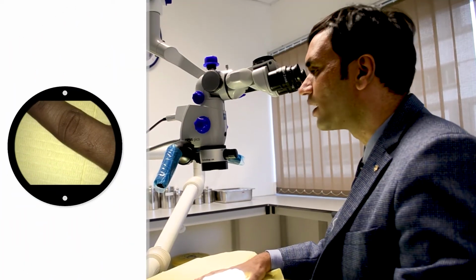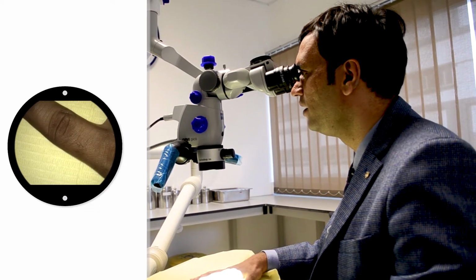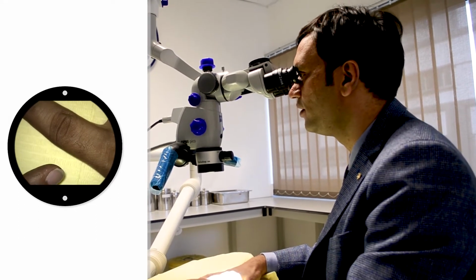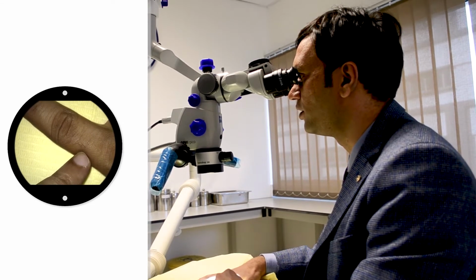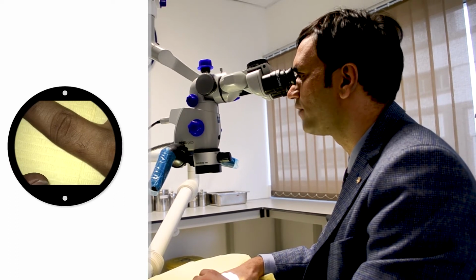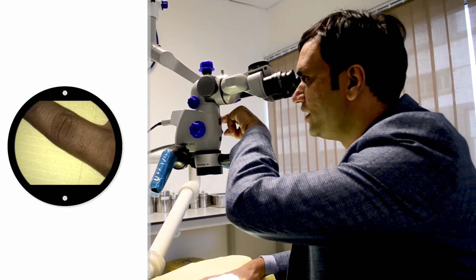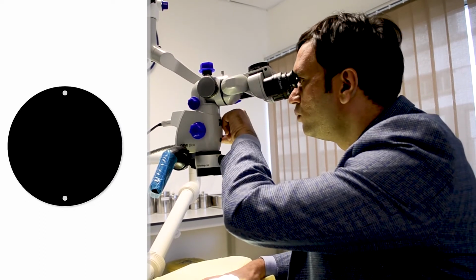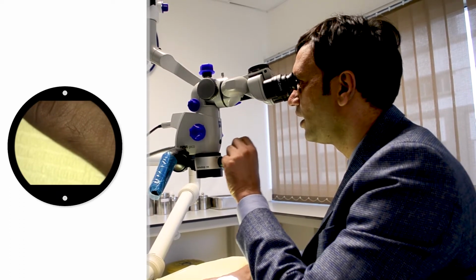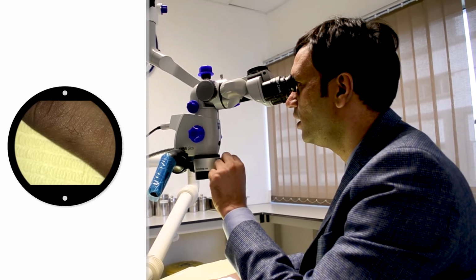To understand the magnification, I would like you all to focus on my hair on my finger. Here you can see a larger portion of my finger and hair. This magnification is at 0.4 magnification factor, and you can see that it is not so blurred, and the clarity is okay. Then when you move to 0.6, you see that it becomes a bit blurred, right? And I have to adjust a bit to make sure it is in focus.